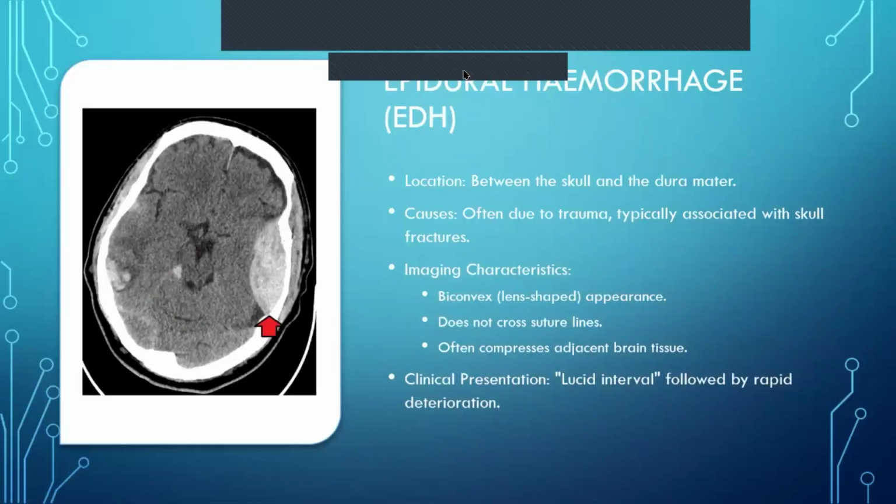Okay, so now what I always like to tell people, because even before we read all of this and go through that, the one thing that you'll notice about an epidural is that it has a roundish shape, what they call a convex shape. All right, like an eyeglass or the outside of your eye.